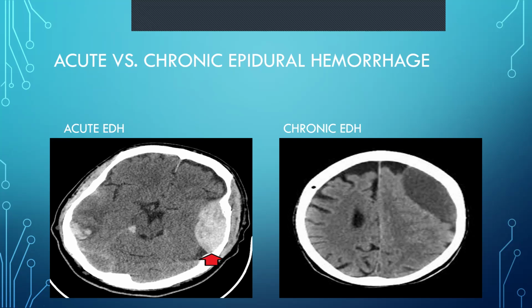Now, there's also edema. There's a few other things as well. And by no means at the end of this presentation are you going to be an expert on CT scans. Please don't go and sit in your radiology department and say, listen, I'm reporting on everything. All of you can go home. No, no, no. That's not the point of this. The point of this is just to give you the very, very basics so that you understand. So I hope you guys understand the difference between the two now, and you understand what an epidural looks like.